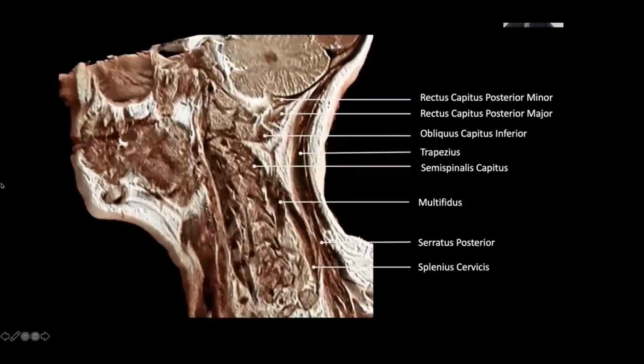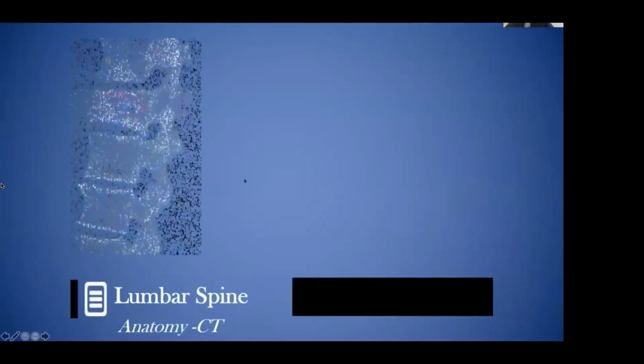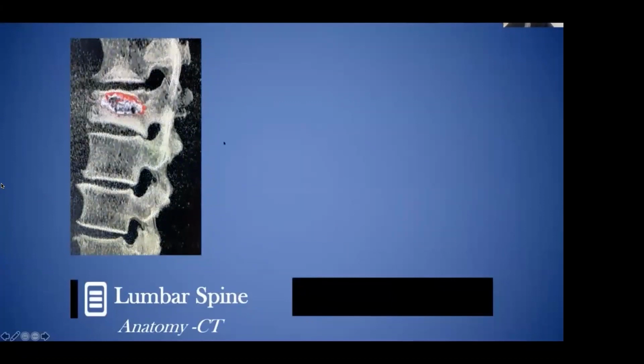Again, just more examples of how we can depict these individual muscle groups. Again, no point in me teaching you how to suck eggs, so to speak. The lumbar spine, very similar situation.